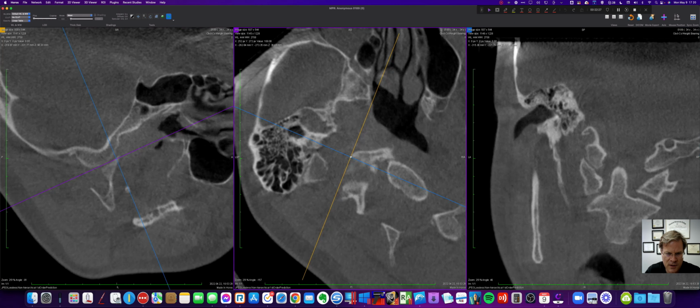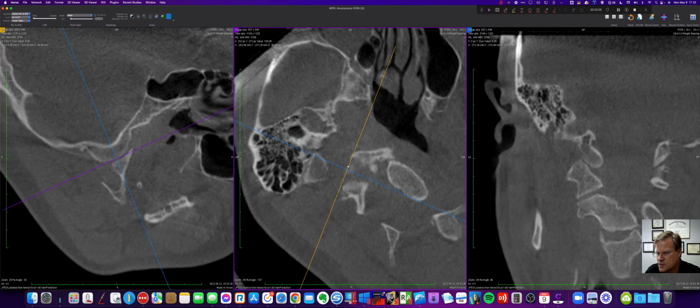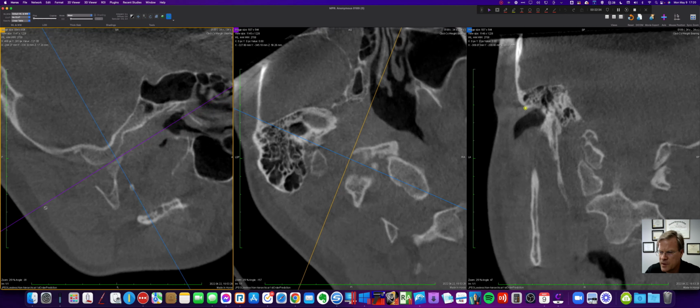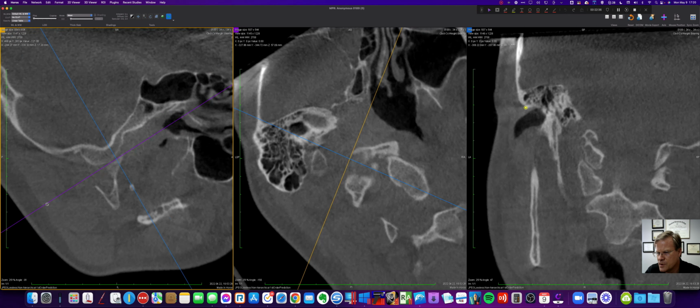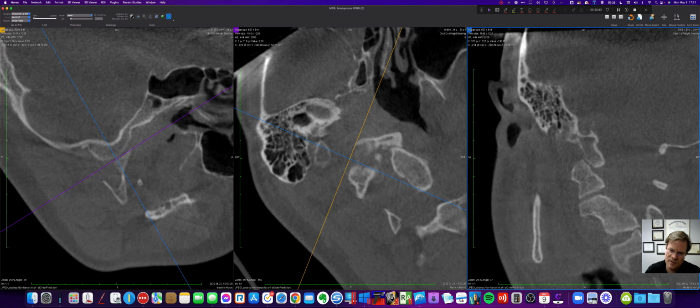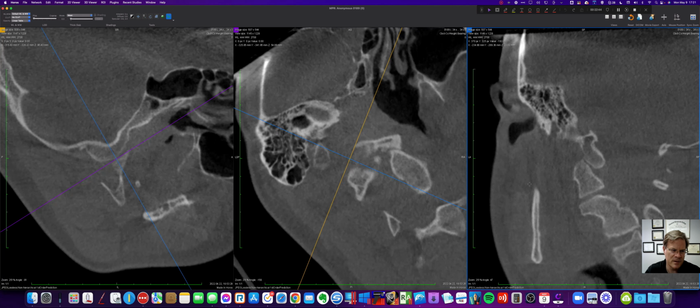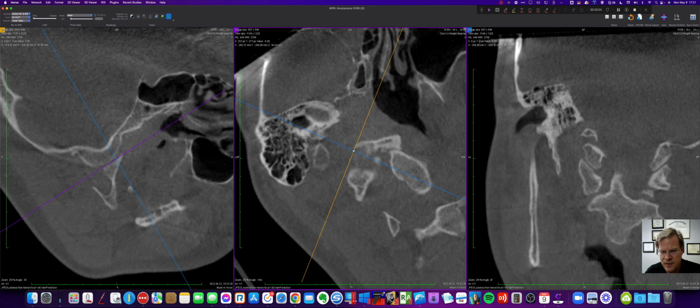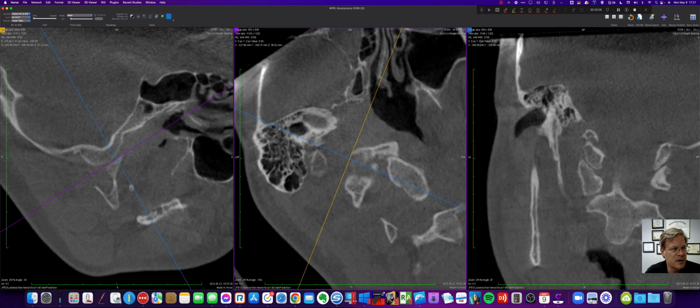Okay, we're looking at the outside edge of the joint. Yeah, we can change this a little bit. That's not going to change too much when we're on such a thin slice. I'm still thinking, see, that looks even. Sometimes you get more questions. So I would go with either even or an ASL. When I'm looking at the joint, it looks like this is the thick part of the joint.